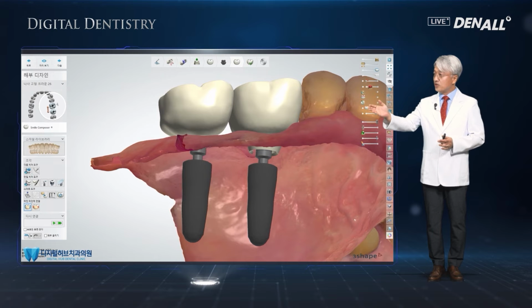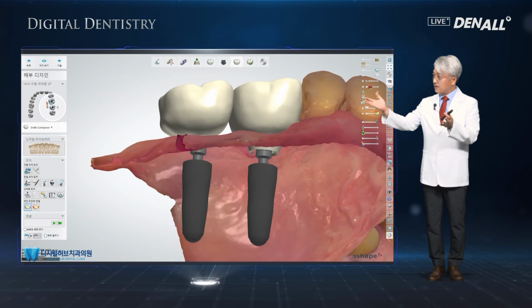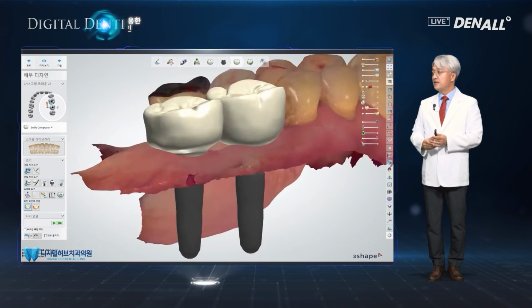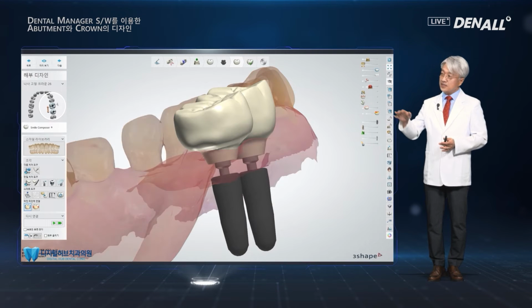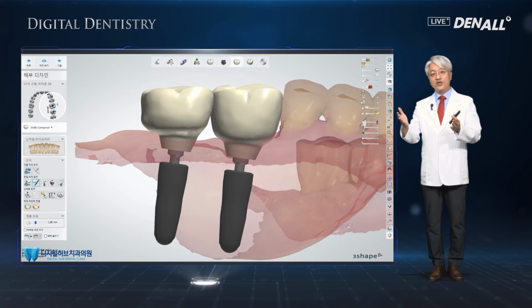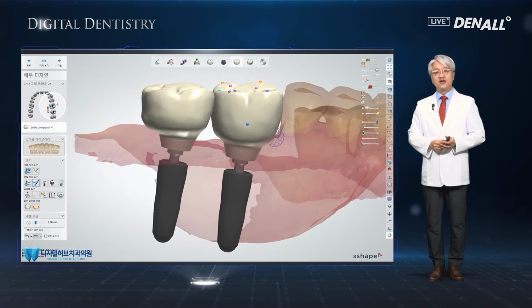At number 6, between the stock abutment and margin, there is a pre-designed crown. There's a cuff to form emergence profile. Now it is being designed. So the gingiva in this situation can be shown half transparently on the software. Gingiva form can be molded whatever the form we may want. That is the advantage of the software, the CAD software.